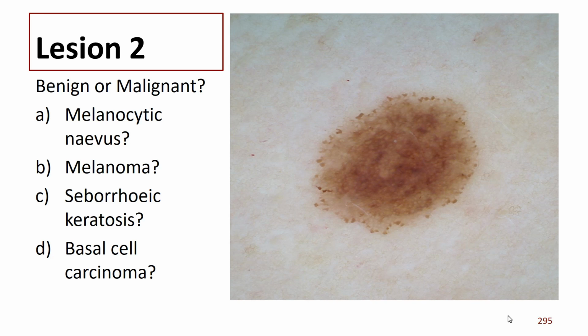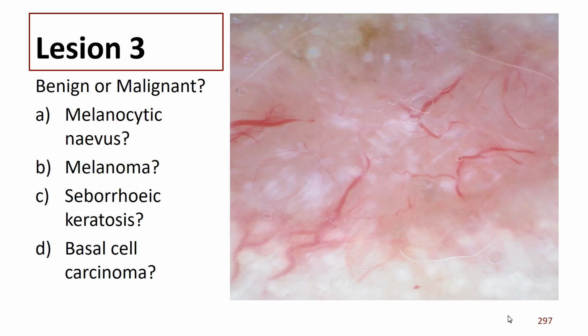Gradually we're getting more and more hands. Yes, it's a nevus. This one, we didn't do basal cell carcinoma, but this is what this is. It's a BCC. So how do you know? Well, it's got sharply focused branching red lines going into the middle. It's got white structures. It's also got a greyish colour, which is typical.